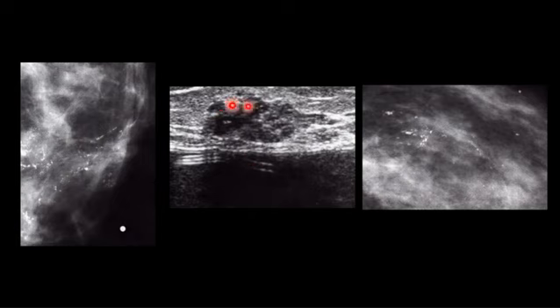So this is a suspicious mass. Okay? Excisional biopsy was done. There was some invasion with a larger area of calcification in a tightly packed linear calcification. The ultrasound may sometimes demonstrate an associated soft tissue component. You see the calcification during ultrasound, you see some soft tissue component, and you can do an image-guided biopsy from this soft tissue component.